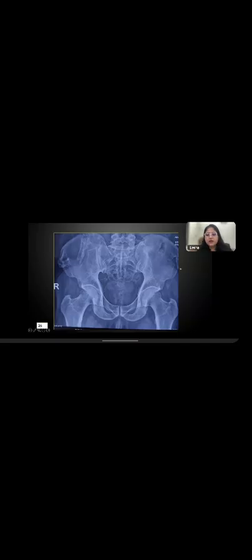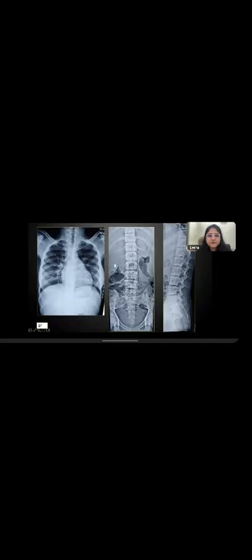Nail patella syndrome is one thing that you must think of. However, the shape of the iliac bones is relatively preserved. So HME is, I think, one of the possibilities. Okay, case 27. What you see here, 27, one or two answers, just give it to me so that I'll start the explanation.